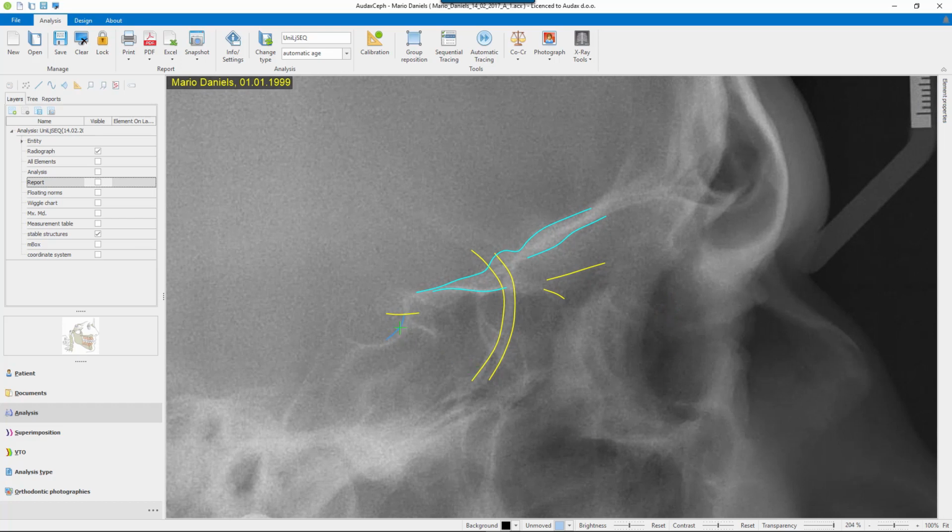This is a stable structure, and if I move along that surface until anterior wall intersects with anterior clinoid process, I come to a point that refers us to the Walker point, and it is stable after 5 to 6 years of age, and serves as the important mark for superimposition. So here we have a point which is called Walker point.